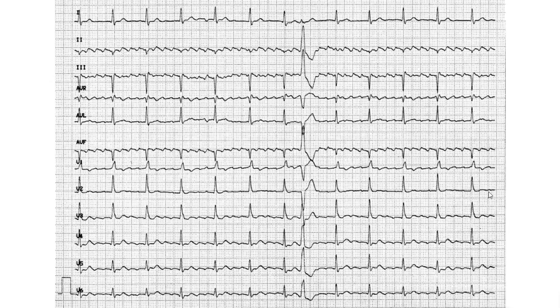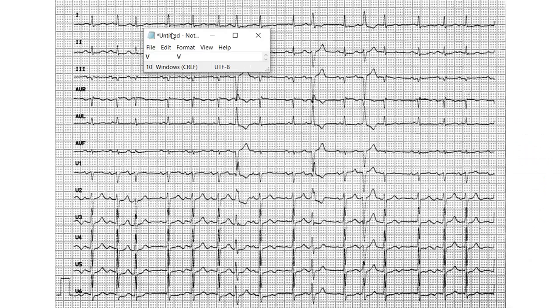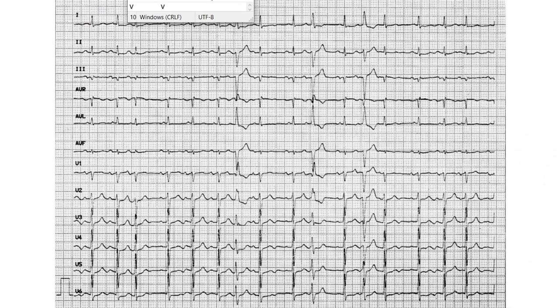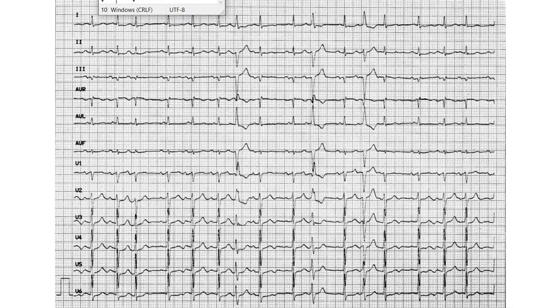Okay, onwards. Here, you can have a few seconds. You can pause if you'd like to think about this first. Alright, so here again, we're just scanning, and you get the same idea. You scan through the paper and you check, is it regular or not? But what I wanted to highlight is that even just by seeing it, you clearly see that it is irregular.